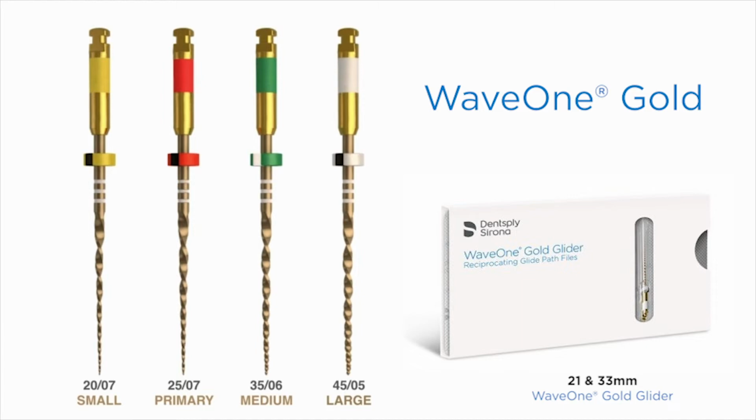And then, of course, the main nomenclature to bring your attention to is that we speak of the small, primary, medium, and large files. Primary is used because it is virtually always the first file that's used in any particular case, whether it's an anterior or posterior tooth. I'll talk to you a little bit later when we might use either the small or the medium or the large. But primary is the first file used.